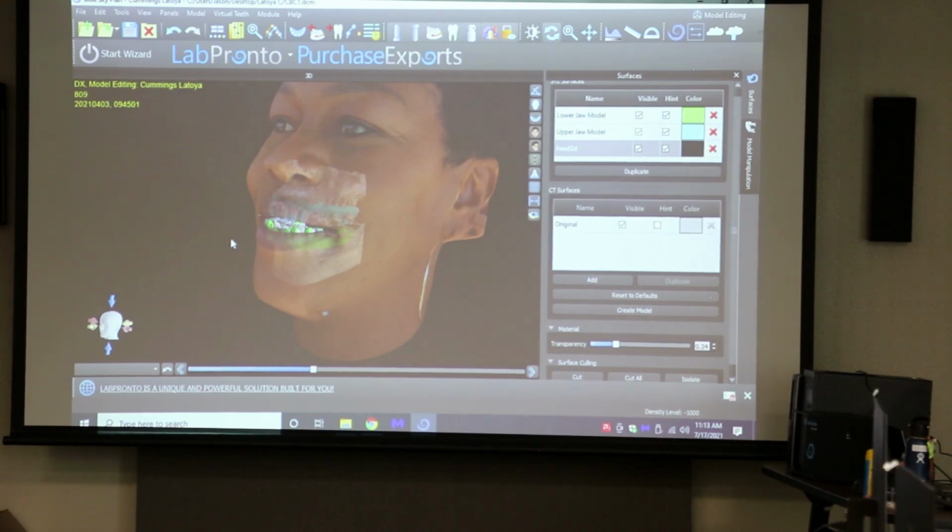Yeah. So after you cut the mouth out, that's the only thing those are really used for. Then you can make the CBCT visible, make the skin visible, and then line up her lower nose. Present something, like you set teeth in it and show. That's kind of what we were working on here. She was closed before.